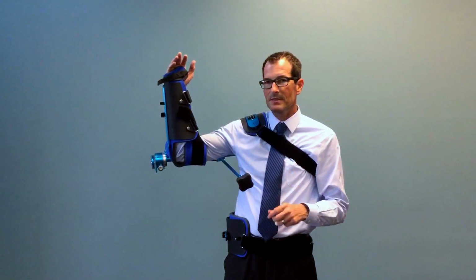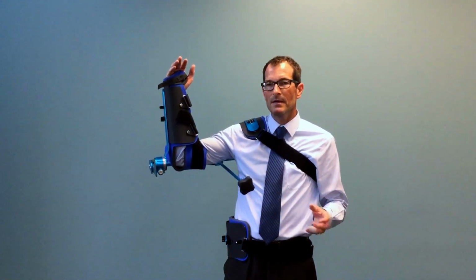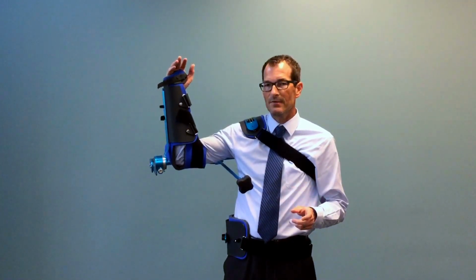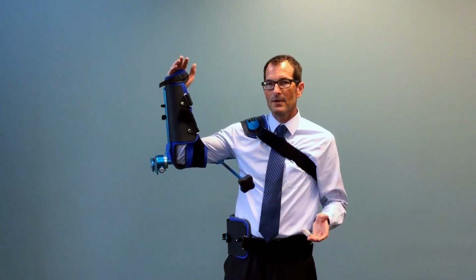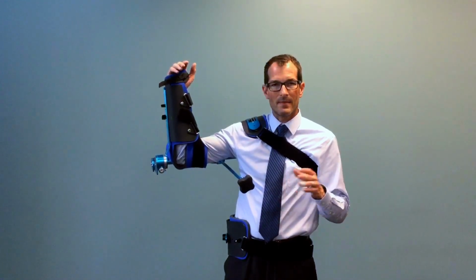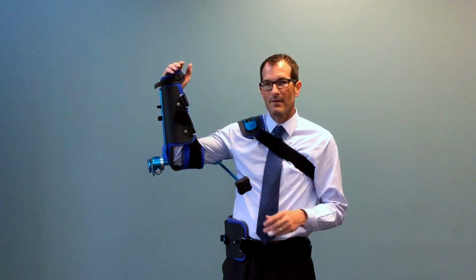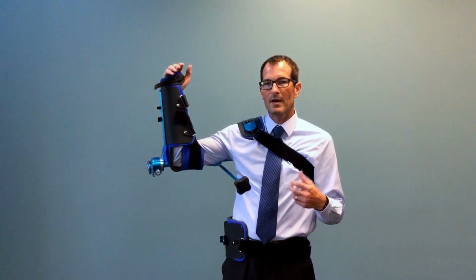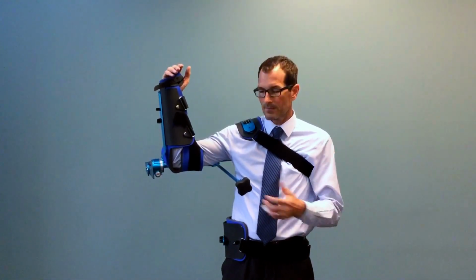In regards to measurements for this product, we're finding that 90% of the population actually fits into a medium cuff. And so when you identify a patient who you would like to utilize the product for, unless your patient is an absolutely petite patient or a patient who's much larger than the average Joe population, we would request that you recommend to your representative that a medium cuff would be utilized.